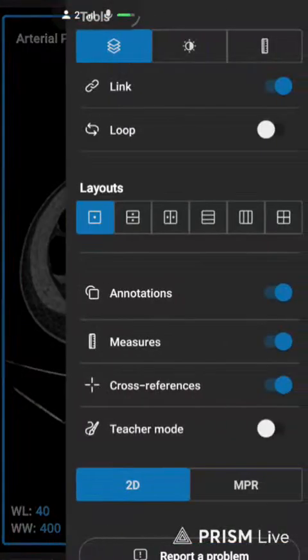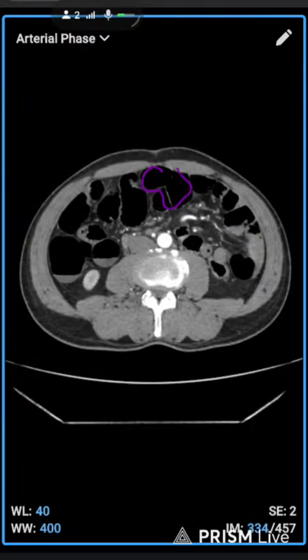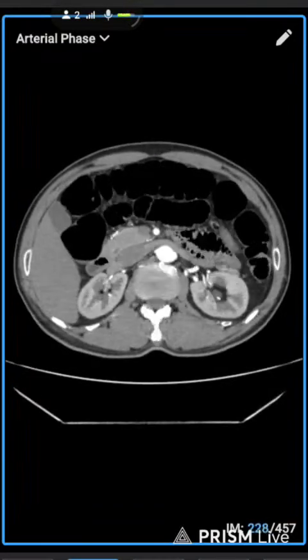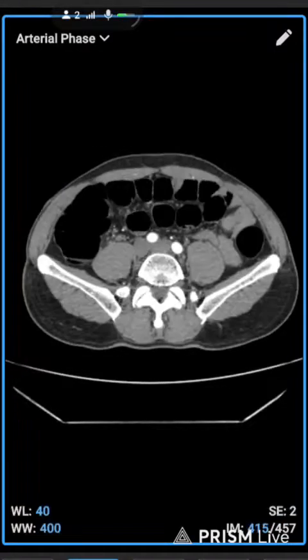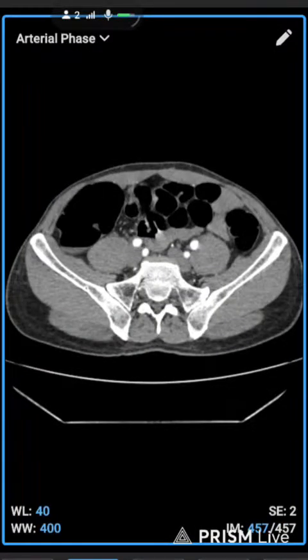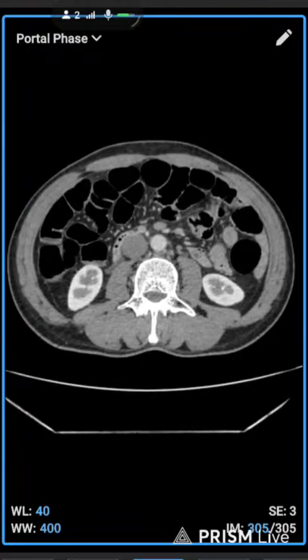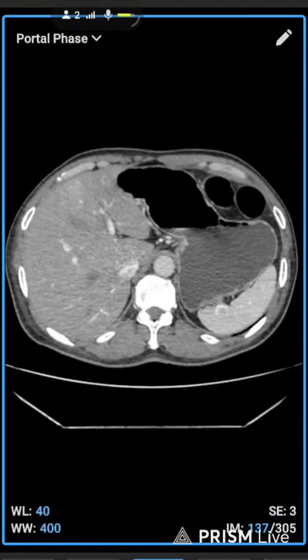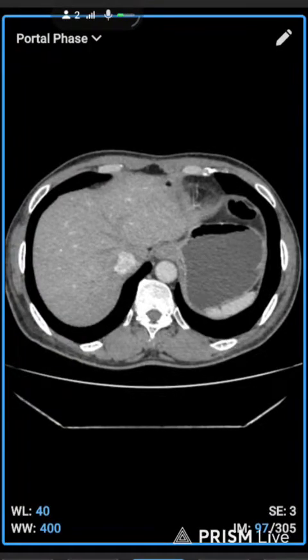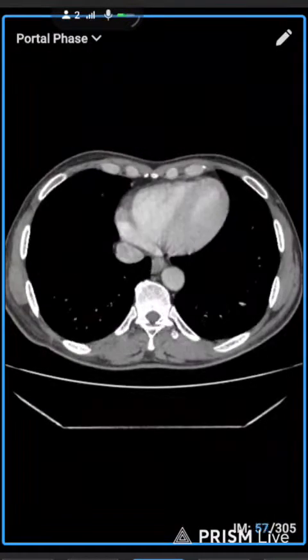Also in the large intestine there was air everywhere in this patient. Every black bubble is air in this patient, maybe because the scan was taken in the afternoon, or the patient didn't drink that much fluid.